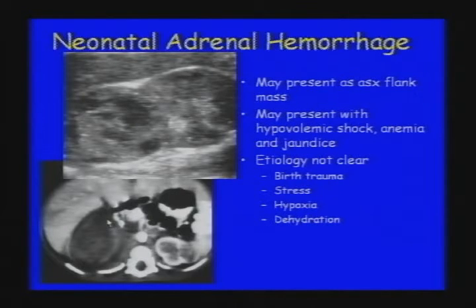I don't know why this particular baby got a CT scan. You do not need to CT scan adrenal hemorrhage, but it's just a nice example to show you that it looks like an inhomogeneous but hypodense mass displacing the kidney inferiorly.